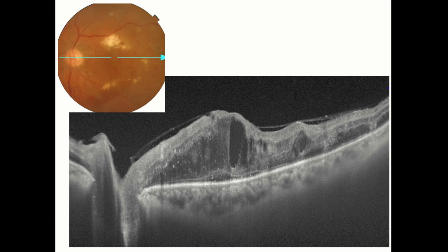Next thing, you see that the retinal layers are not very organized. There's disorganization of the layers. You can see the inner nuclear layer of bipolar cells, but the outer plexiform layer is full of hard exudates. You can see these white dots, and then this is quite irregular compared to a smooth line, and you can see it's even disrupted in this area as well. Then you've got the outer nuclear layer, which seems to be pretty disrupted as well. Somewhere it's very thick with fluid, and somewhere it is thin, and somewhere it is normal.